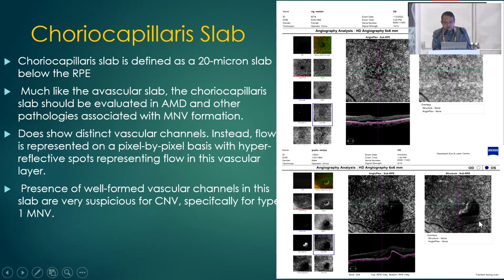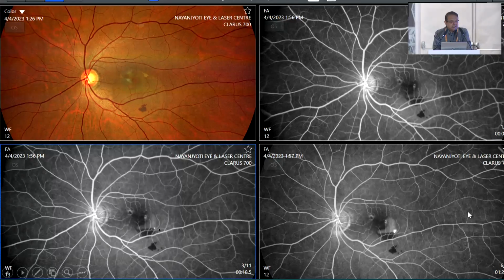And here, you can see there is a polyp. This is one of the patients, who has a subretinal hemorrhage. There is a CSR-like serous detachment at the posterior pole. Once we do a fluorescein angiography, you can see a leak here, and there is a polyp-like thing within the pigment epithelial detachment which leaks. See, these images are fluorescein angiography images.